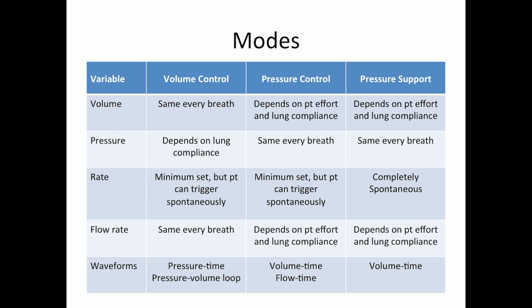Big effort will equal big volumes. Little effort will equal little volumes. The pressure they get is the same, and in that sense, it's very similar to pressure control, but the way the pressure is delivered is slightly different for reasons we don't need to get into right now. The rate is completely spontaneous.